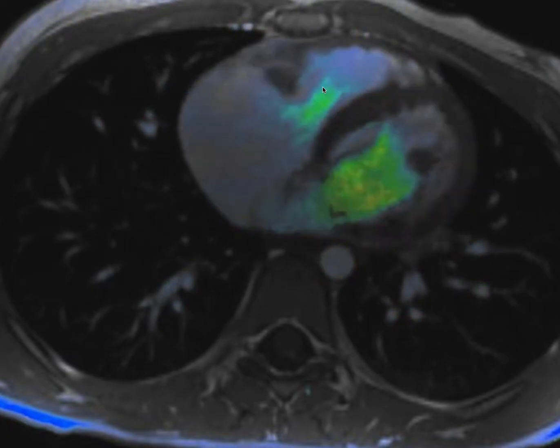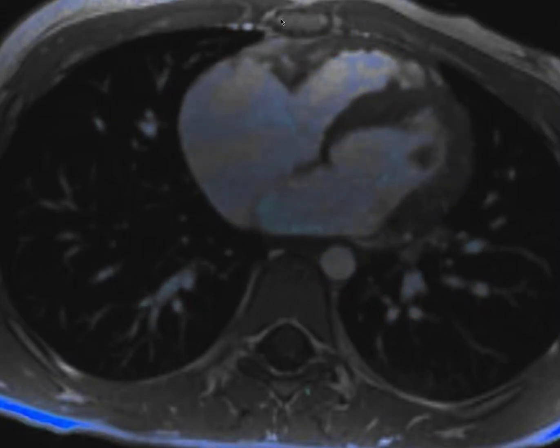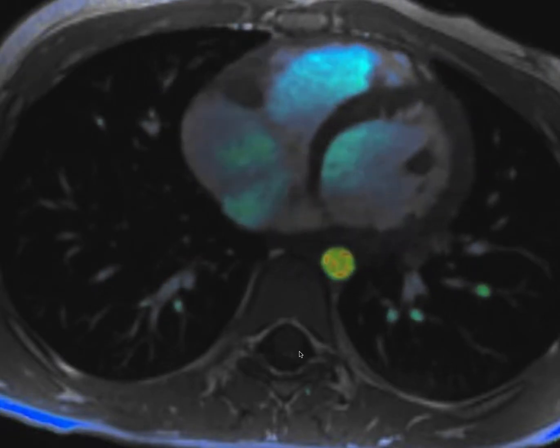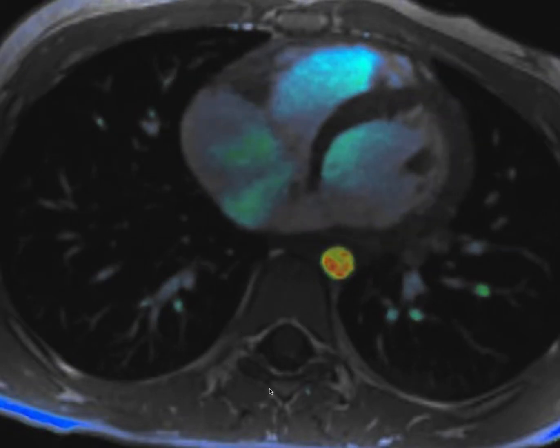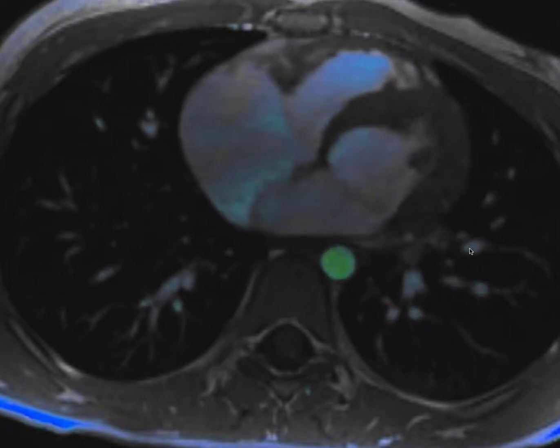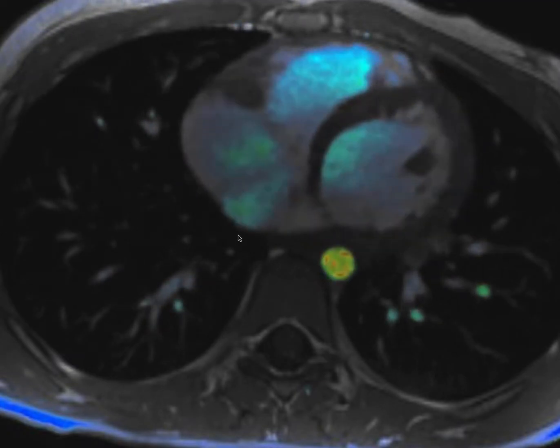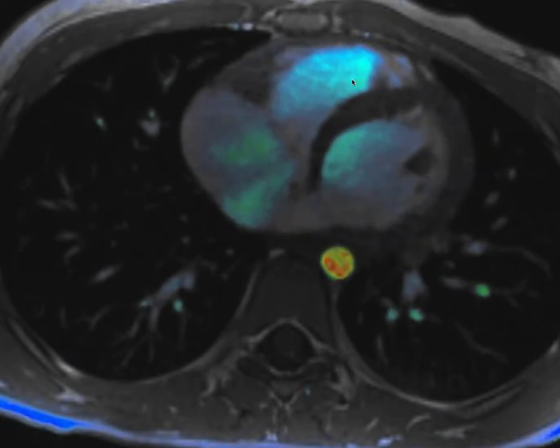The right ventricle is usually anterior to the left ventricle. Just for reference, anteriorly here you can see the sternum in the anterior chest wall. Posteriorly you see a vertebral body and the spinal cord sitting in the spinal canal. So this is all posterior. And again, right is here, left is here, as we're looking at these medical images in standard convention, as if from the foot looking up towards the head. The right side of the body is on the left side of the image. Again, here's the right ventricle that's receiving blood from the right atrium.